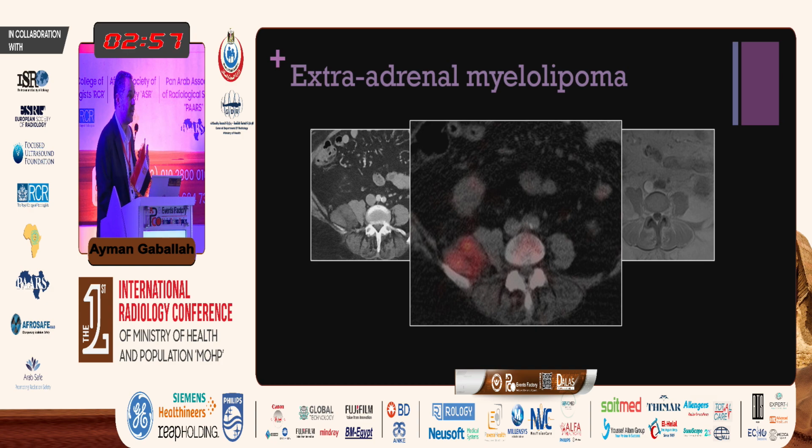Don't remove it. And the reason I said we learned the hard way is because our surgeons removed a couple of these cases before, and some of the cases came back as myelolipomas, extra-adrenal myelolipomas. So hopefully, when you see some of these masses, especially when they are very well defined like this, try to do a sulfur colloid scan before you call it liposarcoma, especially if it's very well defined like this and not a very aggressive mass, before even putting a needle there for biopsy.